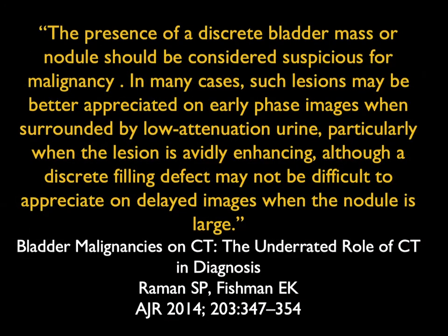One thing we've also said, that was a big tumor. We see many bladder cancers that are small, in the 1 centimeter range, and the key thing is they're hypervascular. And in this article with Rahman, we made the point that many of these are incidental. We picked them up while doing a study for, let's say, an aortic aneurysm, and there, lo and behold, is an enhancing lesion in the bladder, and it's a bladder cancer. So it's an important diagnosis, particularly in older patients, patients over 60, if you call that old. But the bottom line is that it's one of the things you need to think about.